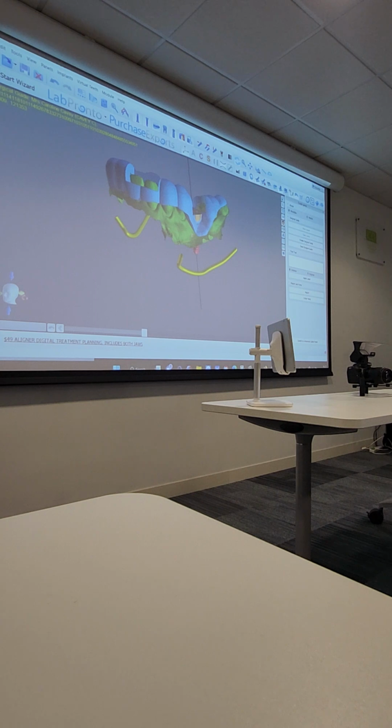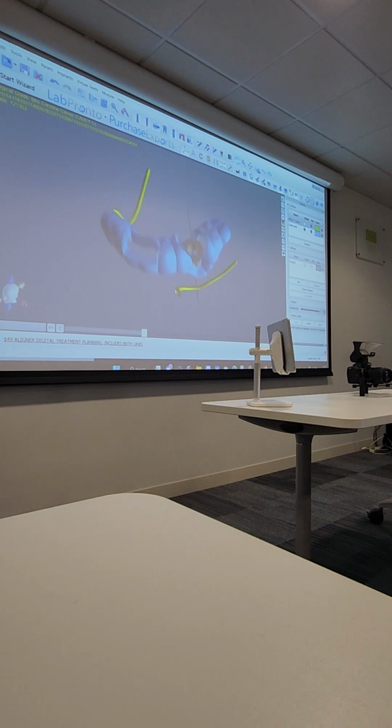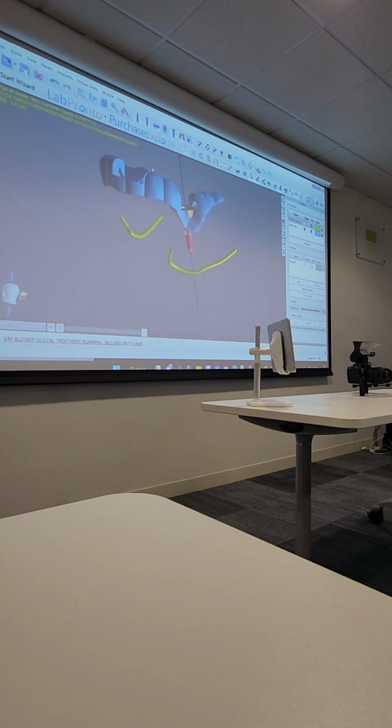If you go to surfaces now, you can see there's another surface added, which is the guide. We can take the guide away if you don't want it. What we're going to do instead is get rid of the green so that we can look at our guide. Look at that, we've got our verification window. I should have gone through a bit more so it's fully open, but that's your surgical guide done.